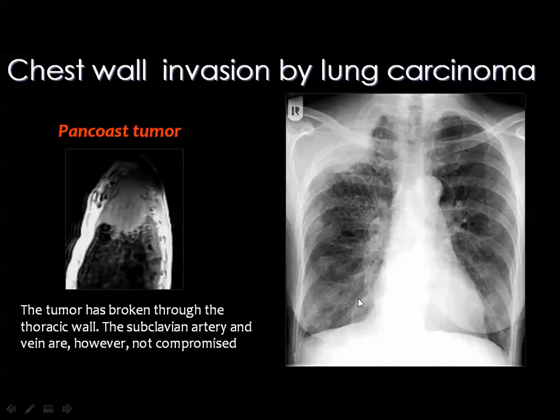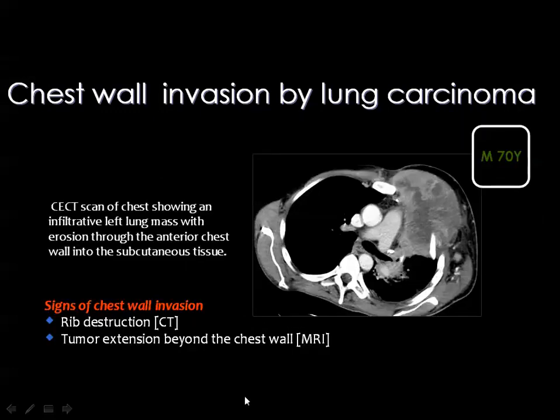And I hope you remember that I have said that whenever you diagnose Pancoast tumor from the plain film, then the next modality of choice is MRI for preoperative assessment to see if the lesion is operable or inoperable, because you have to identify the relationship of the tumor to the brachial plexus nerve roots, to the subclavian vein, and to the subclavian artery, and you cannot reach this information without the MRI, especially the sagittal views.